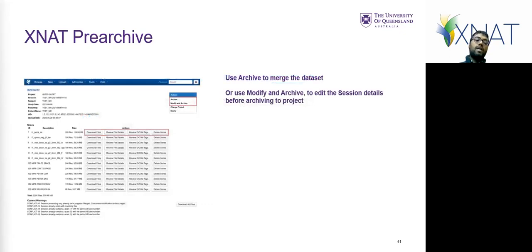So if XNAT can merge the data sets, it won't overwrite the same file, but it does a merge operation. So it will combine data sets together.